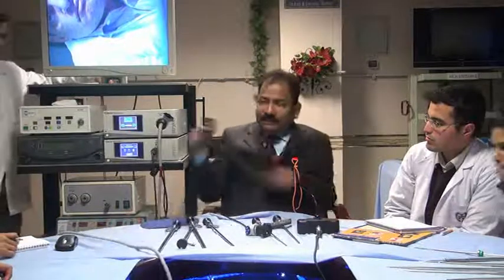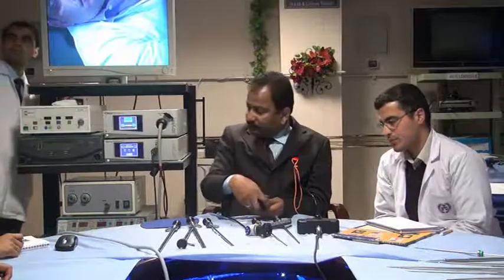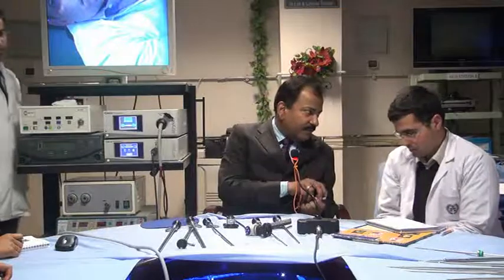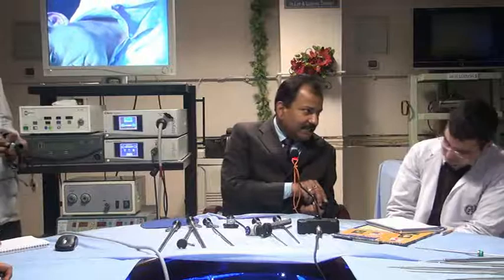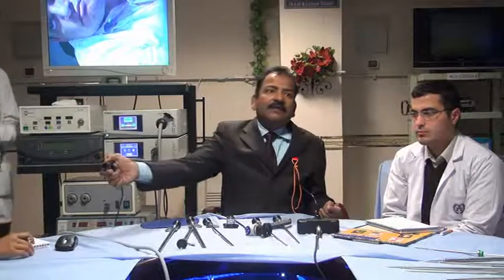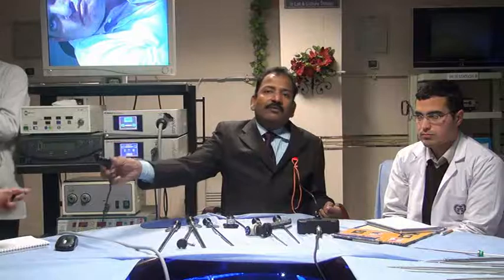Inside the single chip camera, if you see, there is one IC chip. Can you see that? Green color chip is there. It is just like an electronic chip. This is photosensitive, just like our retina. If light falls there, photons will drop there and make electrons.